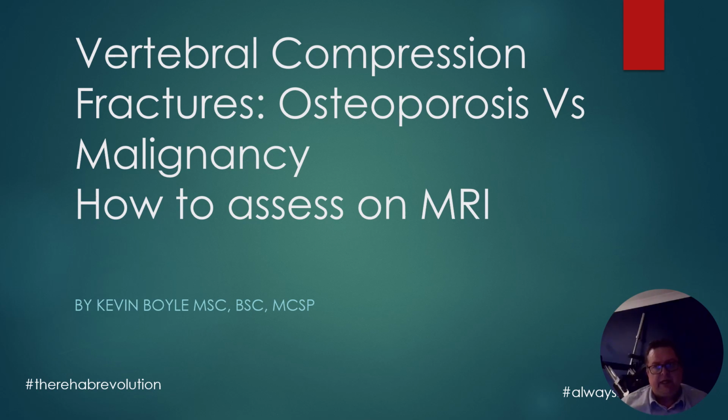This week's learning is about vertebral compression fractures and how to use MRI to assess them, and hopefully some points to look at for helping us distinguish between osteoporosis and malignancy. Now, just before we go on, I am not saying for 1 minute that if you go through this presentation you can suddenly diagnose cancer.